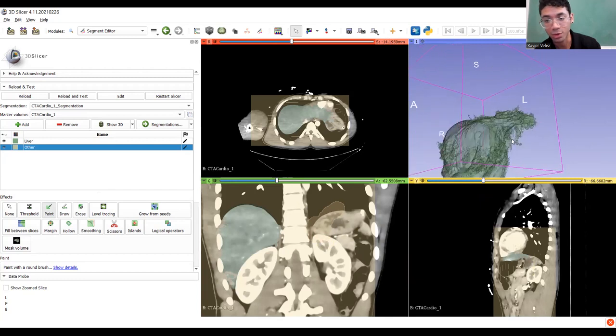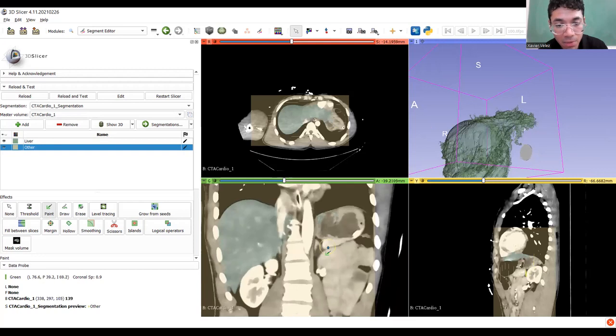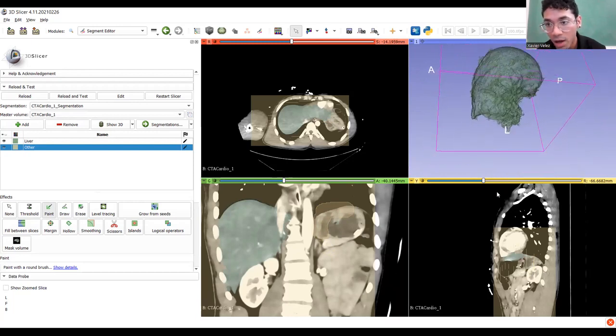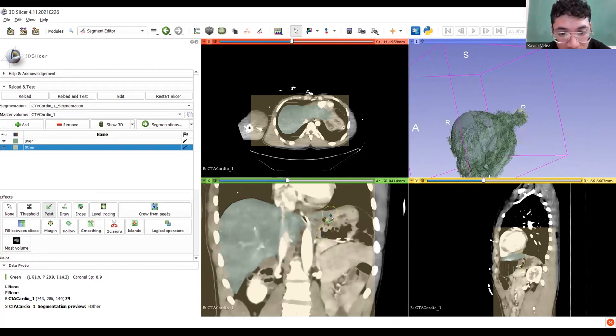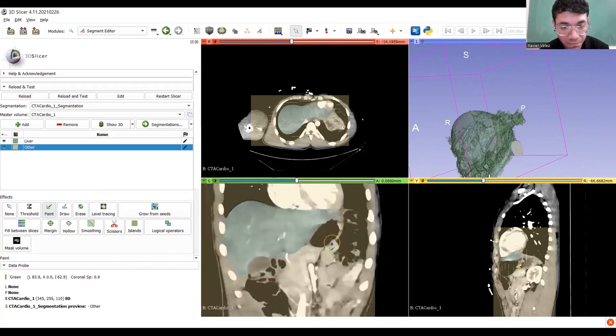well, not a whole lot of that stuff went away, but that's okay. That just means maybe we'll do a little bit more cleaning up around here. I can see there's more of that green here, so I'm just going to cover that and take that away. We don't like that. So it's getting a little cleaner. It's still pretty rough. Let's see if we can take a little more out of that before we start finalizing things. One thing to note is that it's never going to be clean at this stage.